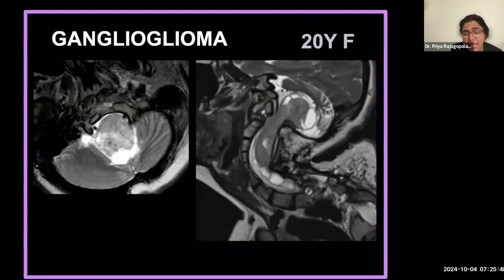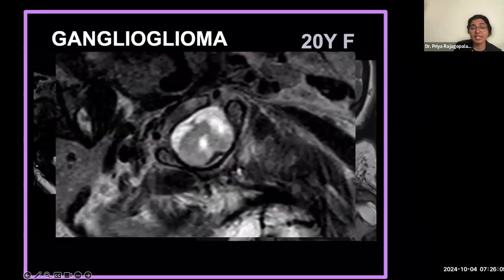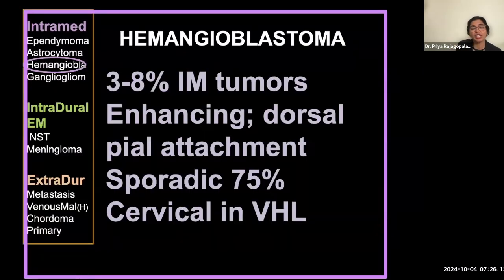Now, here's a mixed neuronal and glial tumor. This is a ganglioglioma, biopsy proven. And as you can see, it is arising in the brainstem and the upper cervical spinal cord with a lot of cysts at the top, a polar cyst, and also some cystic changes within the tumor itself. Very expansile mass, initially presented to our pediatric hospital, and now is being followed in the adult setting, adult care. So those were our glial origin tumors, and mixed glial neuronal tumors.